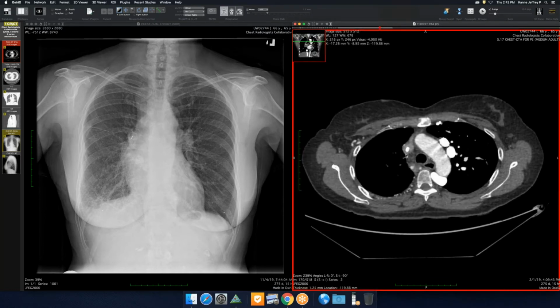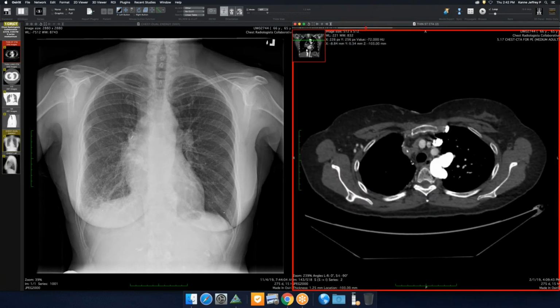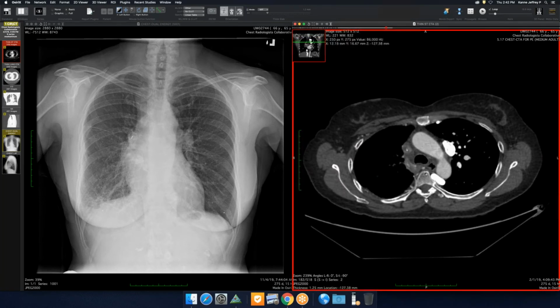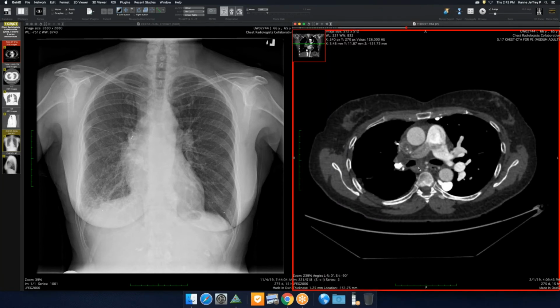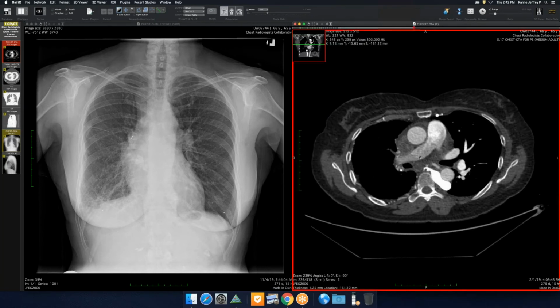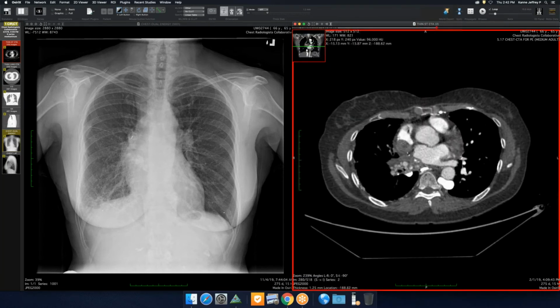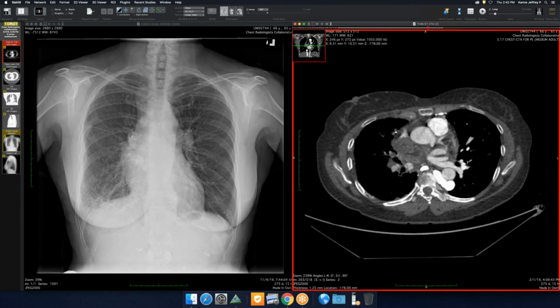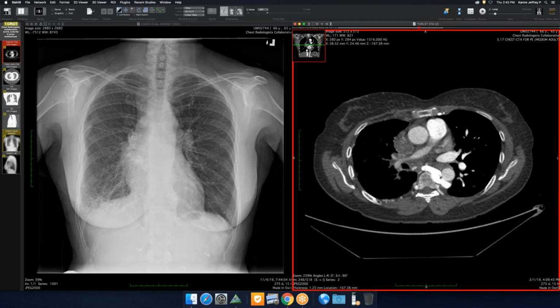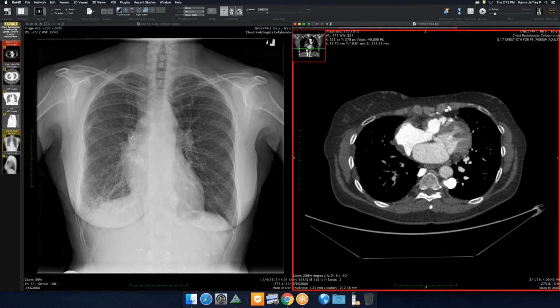And we see that the superior vena cava has this calcium in it, but is not receiving any contrast. The brachiocephalic vein stops. And then you can see there's a lot of large bronchial arteries coming off the aorta. And as we go down, we have a beautiful smoke artifact in the pulmonary artery. It's not a thrombus. And you can see there's all this soft tissue around the mediastinum. There's not a lot of calcium in it, but there is some. And then you've got all these bronchial arterial collaterals, and then you've got retrograde flow through the intercostal vein down to the azygous vein, which is then going to go down and come back up the inferior vena cava into the right atrium.